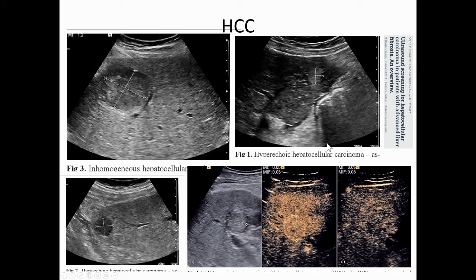However, on ultrasound, HCC has many faces. So it can be hypoechoic, hyperechoic, or inhomogeneous. And if you give the patient contrast material, then you can see that on the arterial phase it enhances vividly.